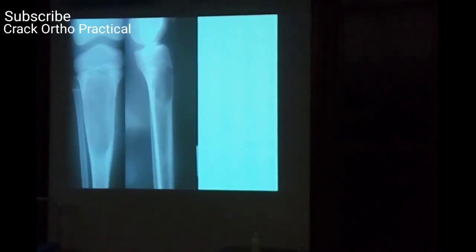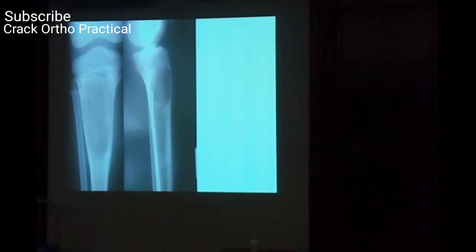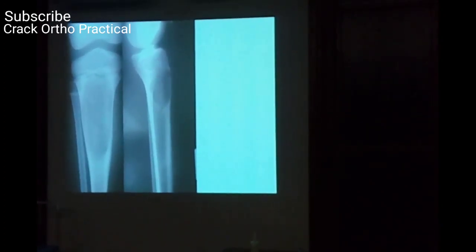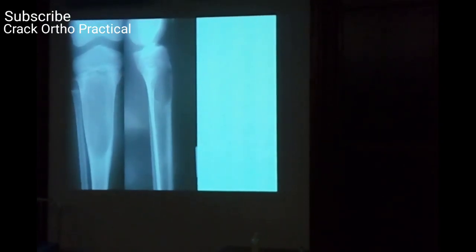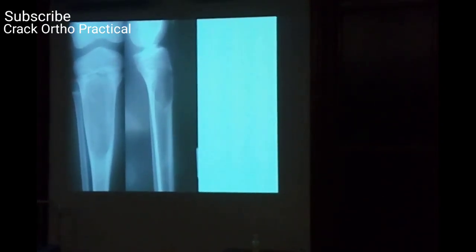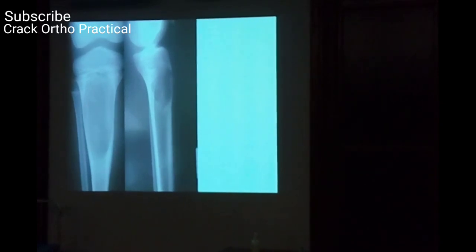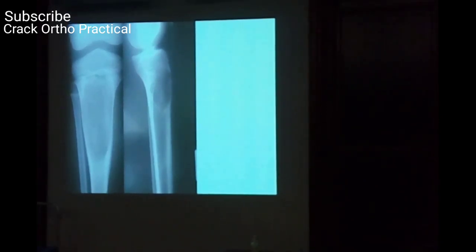Yes. And the cortex is intact, and there is no periosteal reaction and no soft tissue swelling. So what is your differential for this? Is it benign or malignant?